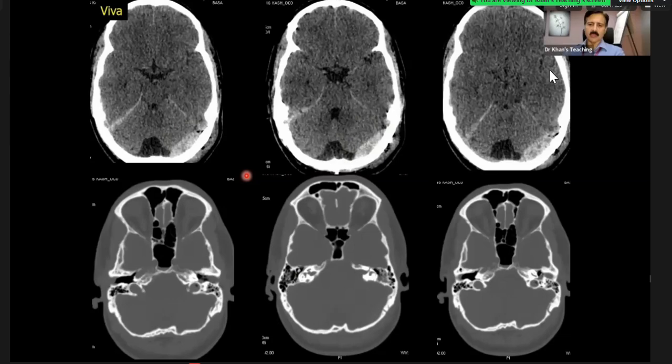Explain that. How can it happen? Etiology. Trauma? Anatomy. No, extradural hematomas. What is normally the cause? It's the meningeal artery. So what has happened here? Shear force. This skull looks a bit deformed.